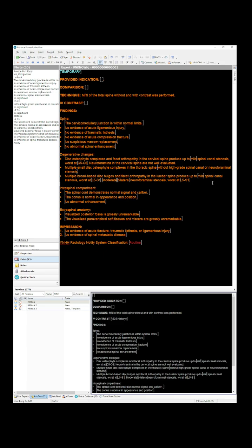And sometimes I'll just delete this, and if they've got prior imaging that's similar, say they've just been imaged yesterday, I'll just say the degenerative changes and the spinal stenosis aren't changed compared to yesterday's exam. Or if there's none, I'll just delete all this and say no significant spinal stenosis is seen, that sort of thing, right? And then, as I've treated the spine itself and the broader strokes of degenerative change, those are the major sections in this report.